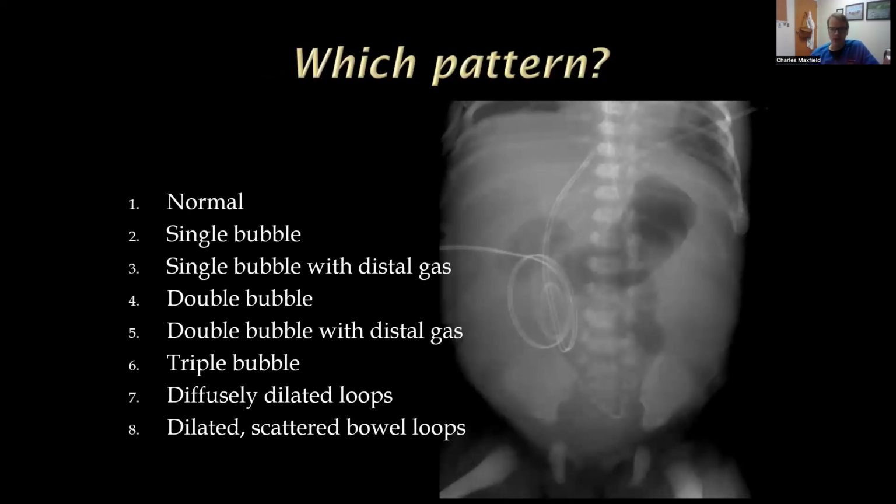Okay, as we work our way through the 8 patterns, here's the next one. And if you look at this, kind of a funny pattern. So you might think, gee, I'm not sure what this is. But again, if you think, all right, there's only 8 possibilities, right? I need to be able to assign these to one of those 8 patterns.